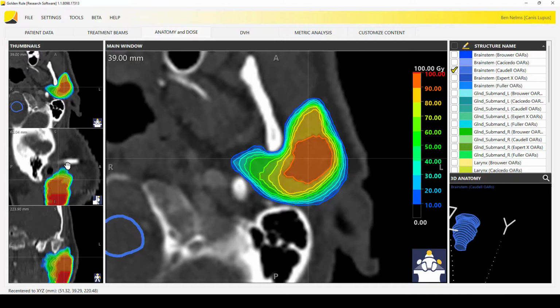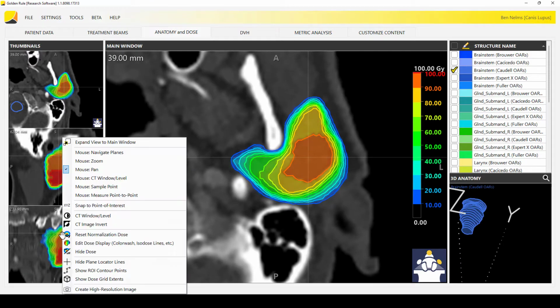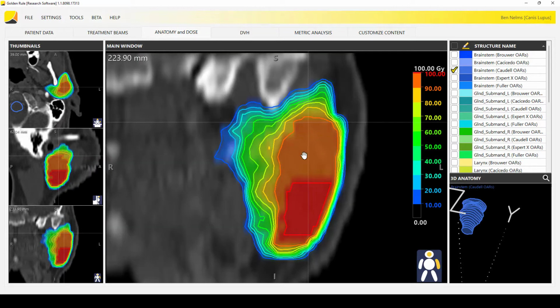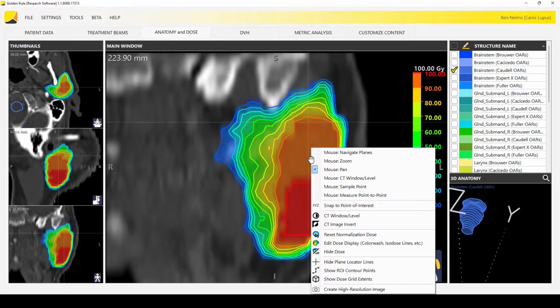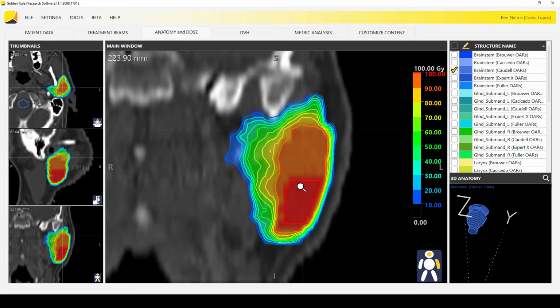So immediately we see something if we look over in the sagittal or the coronal. Let me pop the coronal up. So now we're looking on FAS. We have a much smaller region of complete agreement, but there is this region of agreement in the red down here. That's the volume that everyone thought was part of the left parotid.